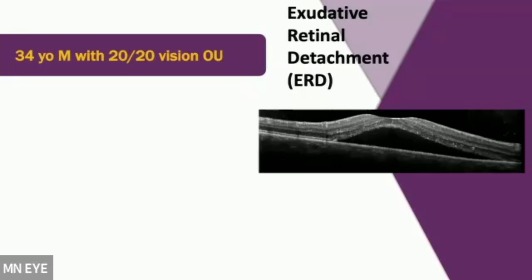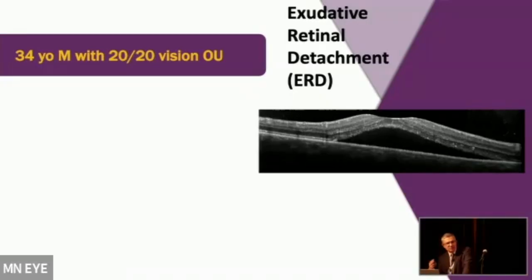Eventually. So this is a patient, a younger patient. Again, very typical. We see in our offices, younger patient, high stress or without stress, known stress, on a steroid or may not. But they come with subretinal fluid. So this is a type of exudative retina detachment that we see more commonly, of course, CSCR.